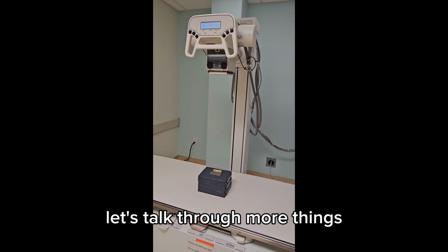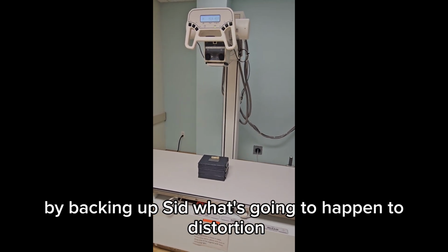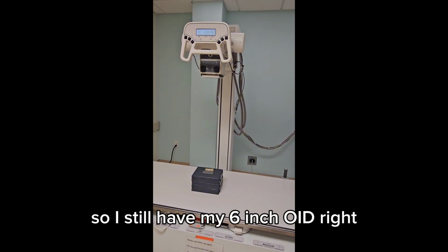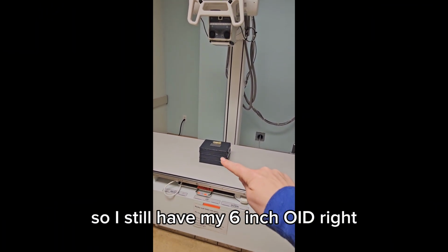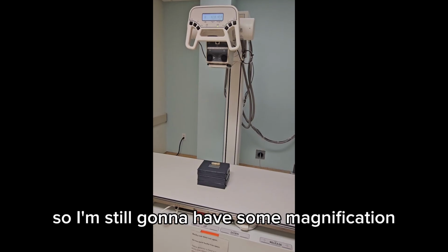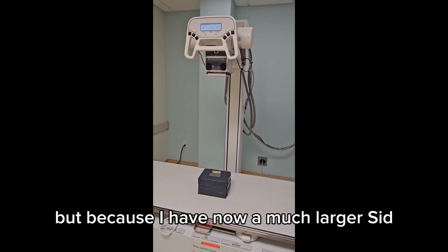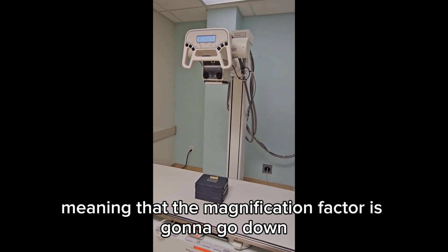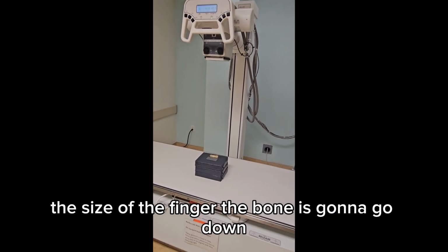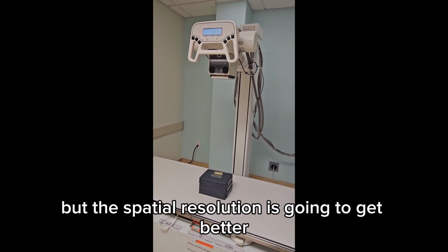Let's talk through more things. By backing up SID, what's going to happen to distortion? So I still have my 6-inch OID, right? So I'm still going to have some magnification, but because I have now a much larger SID, it's going to help reduce that magnification, meaning that the magnification factor is going to go down, the size of the finger, the bone is going to go down, but the spatial resolution is going to get better.